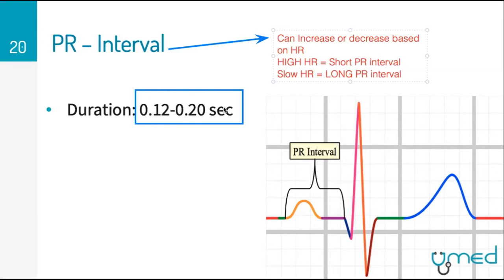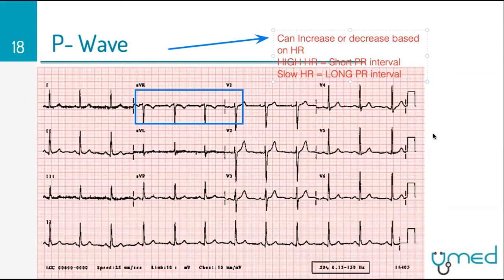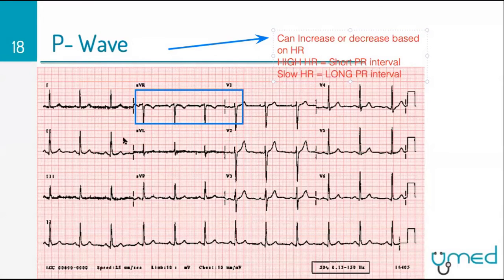Essentially, the reason they call it a PR interval is slightly confusing with the name, right? But some leads on this 12 lead ECG, which you'll eventually see, I'm not going to show it right now, don't show a Q wave. You see how this Q wave is clear cut? Some leads on this ECG don't show any Q wave at all. So because of that, you can't appreciate a PQ interval, and that's why they just dub it a PR interval. Yeah, so it's like a misnomer.